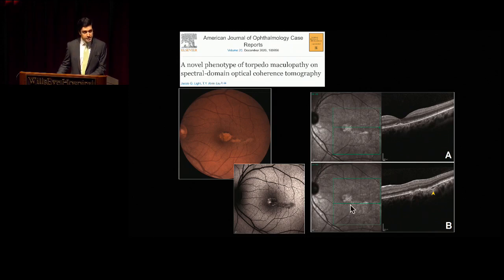But when looking at the tail of the lesion, there was some choroidal excavation suggesting type 2, but the overlying RPE and ellipsoid were completely intact, suggesting that things may not be as clear-cut as one would have. As the attendings alluded to, these patients tend to have a favorable clinical course and no ocular side effects that need to be monitored, with a good visual prognosis usually.